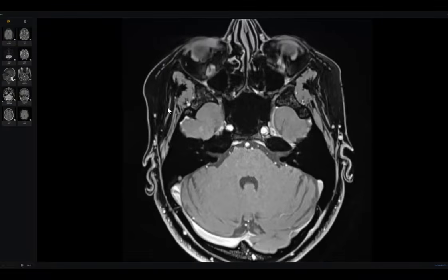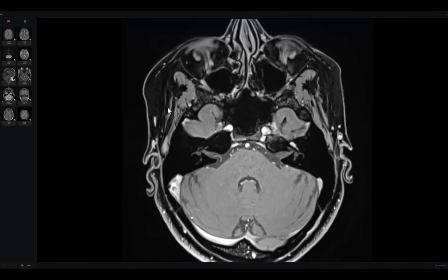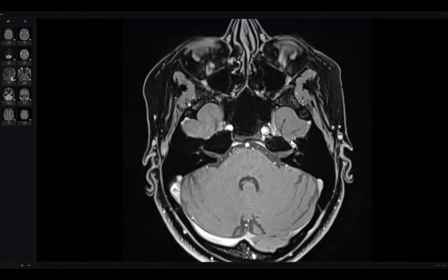For the facial nerve, if you want to rule out, there are only two diseases, to be honest: either schwannoma or neuritis. The post contrast is very diagnostic. See, very obvious, there is something here, even if you don't know the segment. Very clear. Is it clear now? Yes.